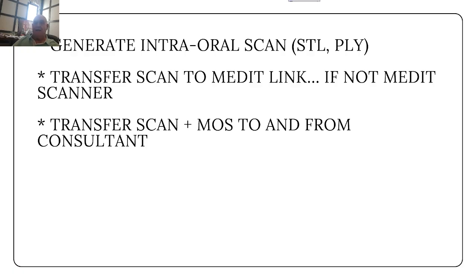And then, of course, you have the transfer of scans and the MOS, the Medit Orthodontic Suite simulation files, to and from the consultant. And the consultant may be sending you back a file to even be ordered. It's an edited simulation to be ordered for Medit aligners. So there are several steps here that you have to master early, otherwise you have a hard time later.